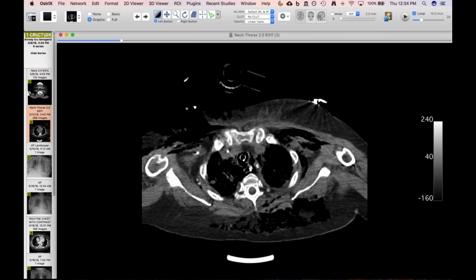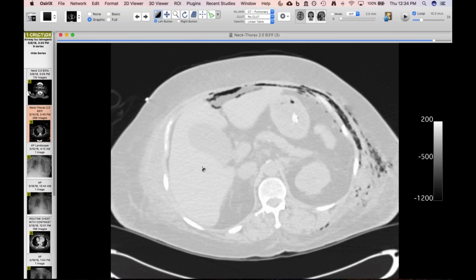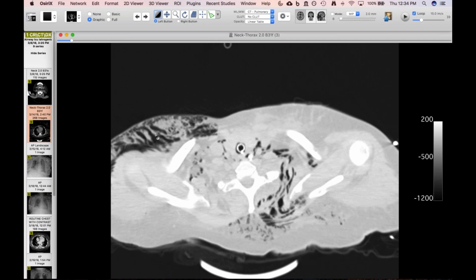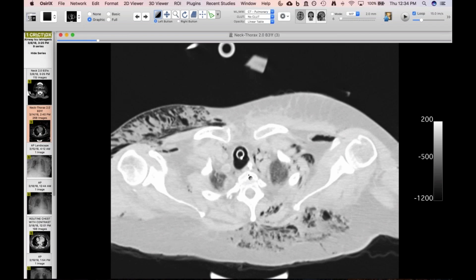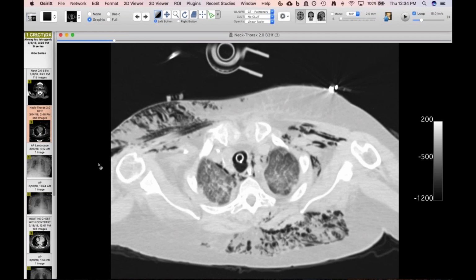Then eventually at the outside hospital, this developed necrotizing fasciitis from this dental abscess. And it wasn't a retropharyngeal abscess, but you can see at the time of this study that she had profound pneumomediastinum and subcutaneous emphysema. And this was on the 14th. She had this CT done. And of course, here's the finding right here, which at least in part explains the pneumomediastinum. And this was not recognized on the outside study.